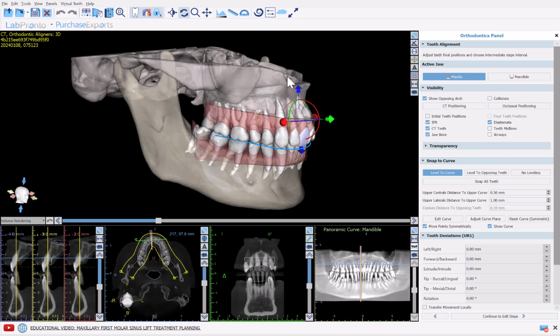Additional follow-up videos will demonstrate advanced functionalities such as designing and exporting the aligners directly from the software, creating an aligner trim curve, and of course, all the export options to add a base for vertical printing, to emboss and engrave text on the model or on the aligners, the ability to order aligners with a click, and the ability to transfer the case to remote monitoring with a click.